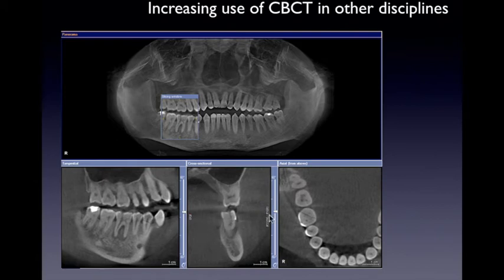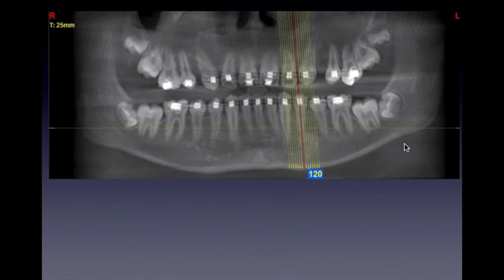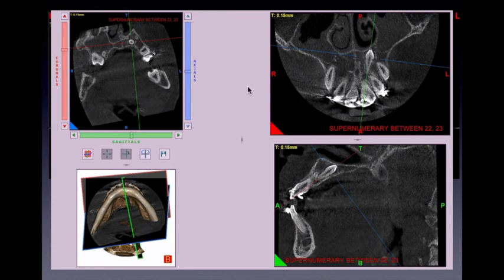Again, CT scan will not diagnose it, it is us, the doctors, that will interpret and diagnose and eventually plan, but three-dimensional image will greatly help in our diagnosing and therefore planning. Okay, so that is increasing view. So again, another particular case impacted, actually, we did not see that impacted tooth before. My friend who does the ortho, we later on found it while we were actually doing it. And again, CT scan will be able to show us something that is very much hidden away from us.